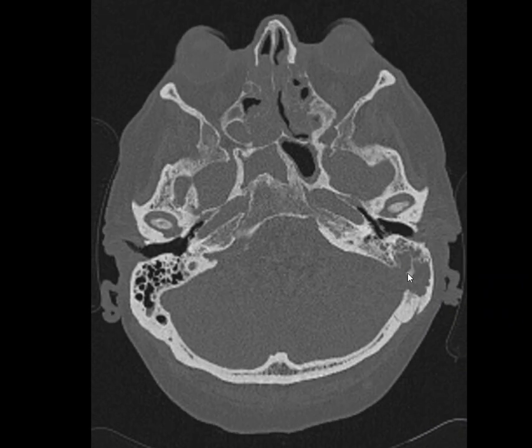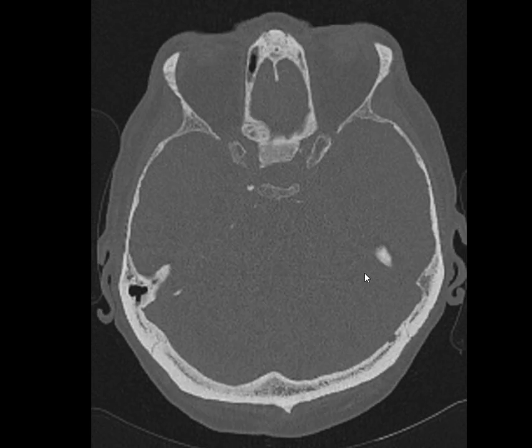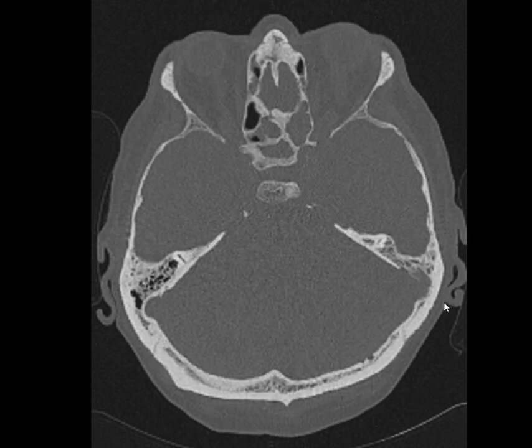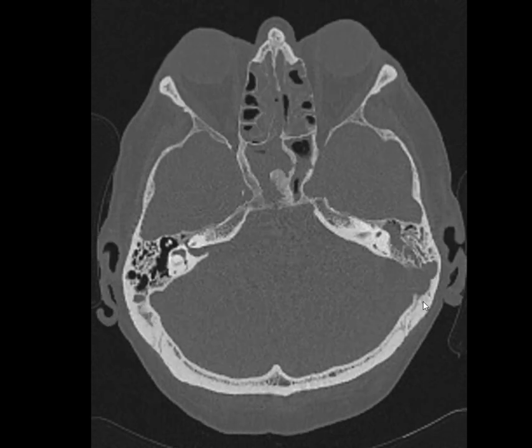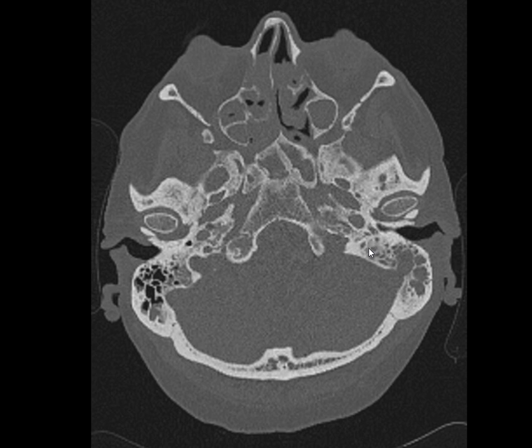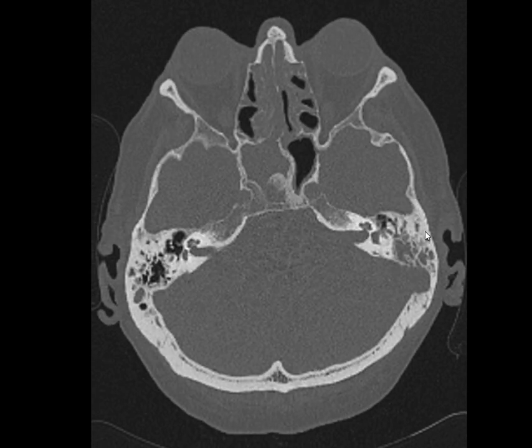that there is erosion of the inner table of the mastoid, and also near complete opacification of the left mastoid, suggesting there is mastoiditis, and it is infective because it is involving the bone. Whenever I'm looking for bone abnormality, I have to look at the ossicles.